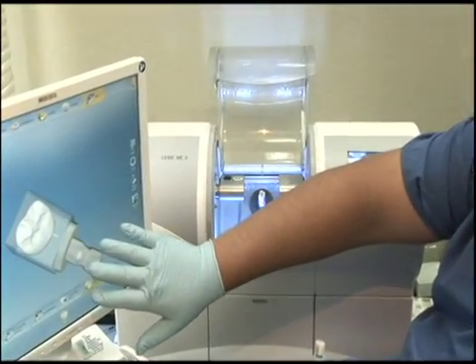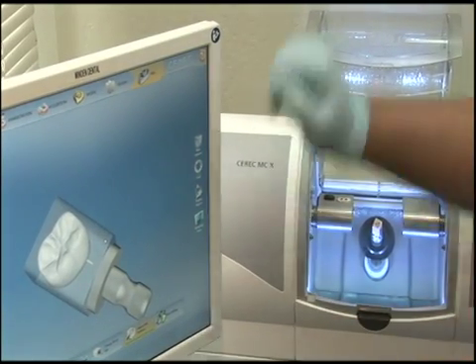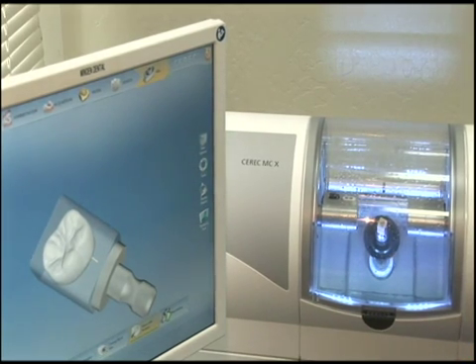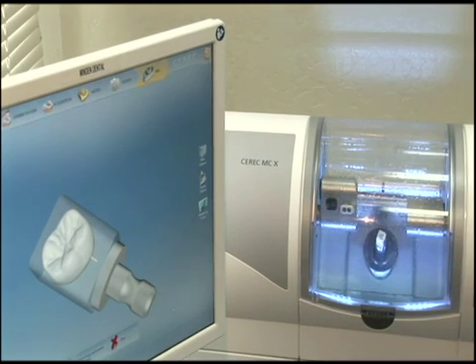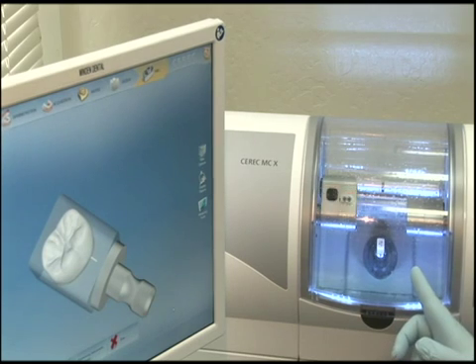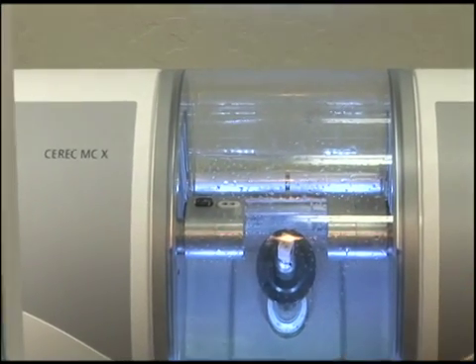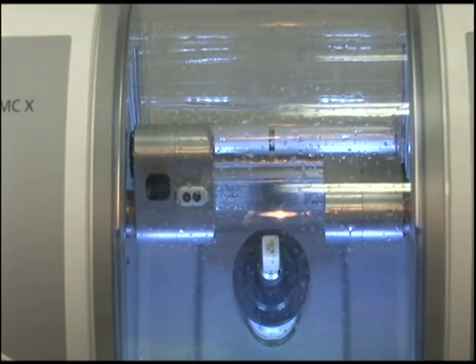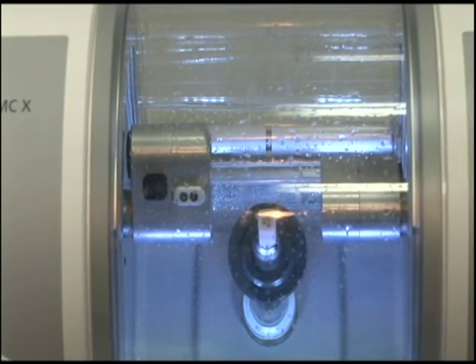We've designed the crown on the computer screen, and we've communicated to the computer-aided milling unit. And now we're going to hit the Start Milling button, close our safety screen, hit the Start Milling button, and it's going to communicate the exact dimensions of the crown on to the computer-aided milling machine. What's wonderful is that each time that this process goes through, the mill will calibrate itself. And so it's going to tell me, please make sure that you have the right materials in there and the right size. I'm going to confirm that I do and hit start. And then it'll give us an approximate milling time, and it'll measure and calibrate.